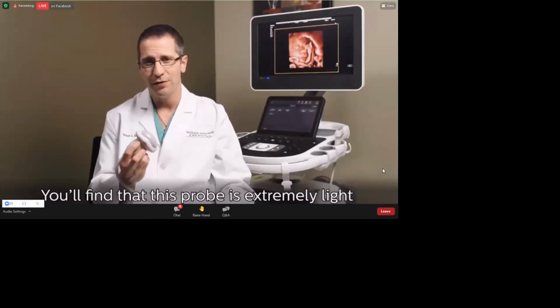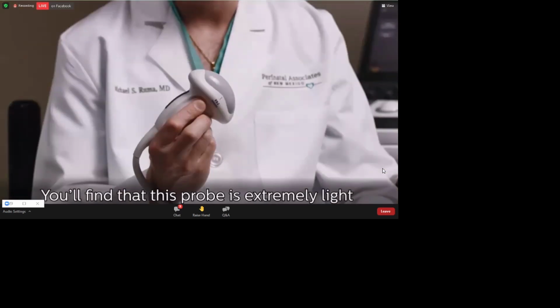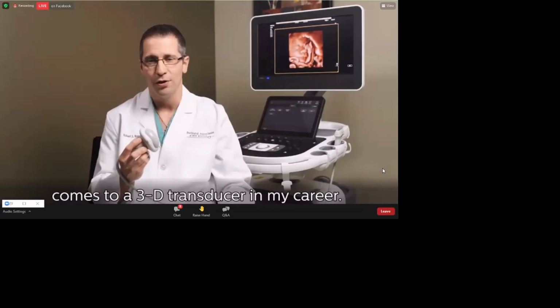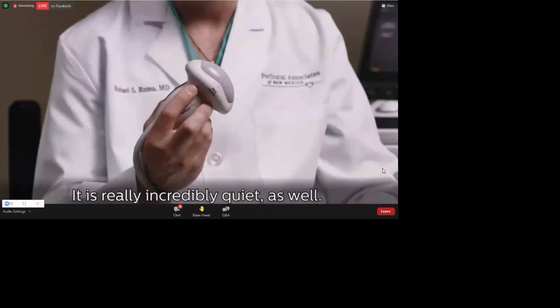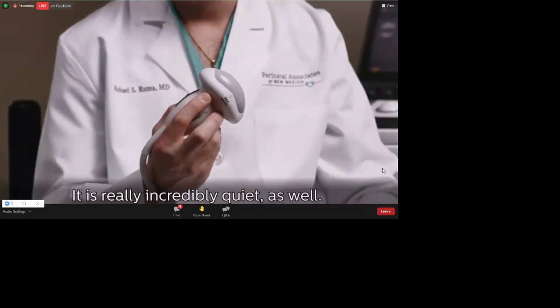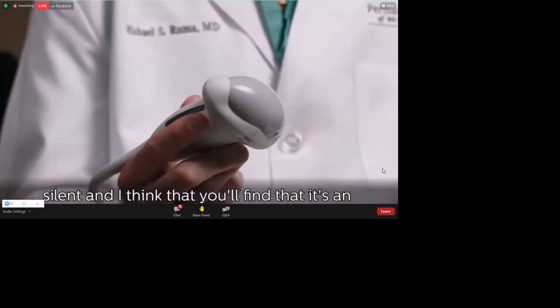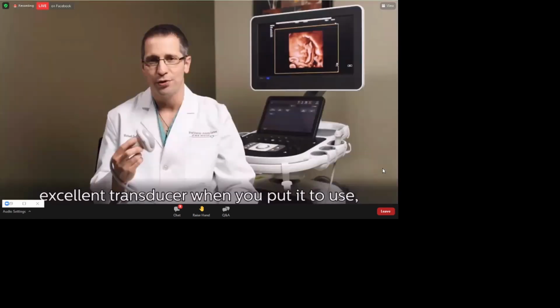You'll find that this probe is extremely light, and in my experience is the lightest ultrasound probe that I have held when it comes to a 3D transducer in my career. It is really incredibly quiet as well. Initiating 3D 4D mode with this is nearly silent, and I think that you'll find that it's an excellent transducer when you put it to use as well.